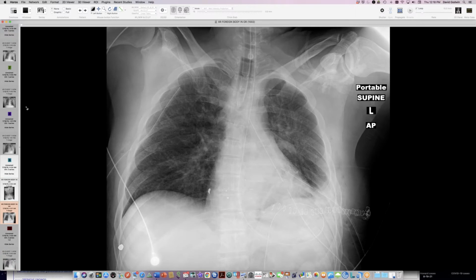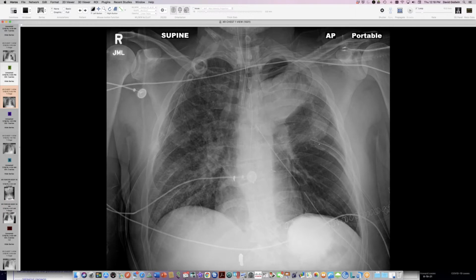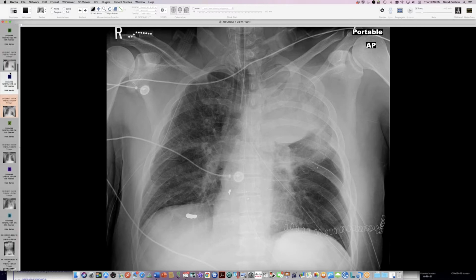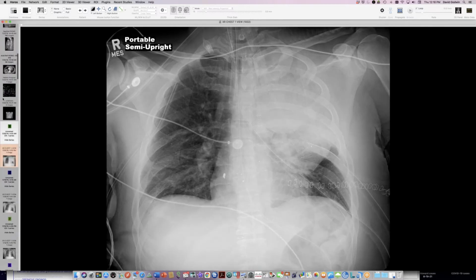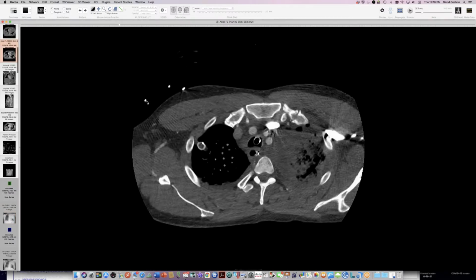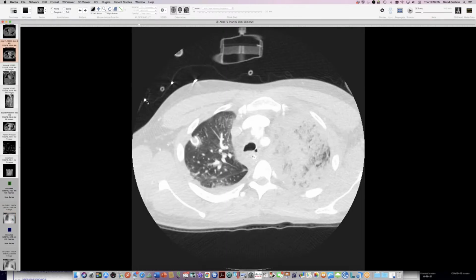But things were okay for a while after the thoracotomy, and then eventually he developed this strange pattern up here with this bulgy thing, looking kind of weird. And then here it's looking more and more angry. And this did result in a CT scan, which we called abnormal.